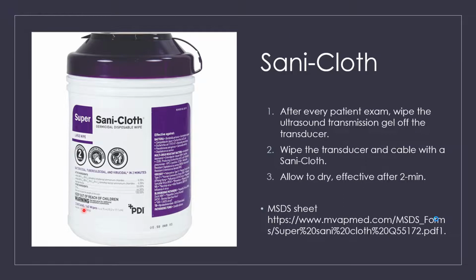Okay, most facilities are going to have these purple top Sani-Cloth wipes. Use these after each patient. Wipe the ultrasound gel off the transducer, and then you're going to get these Sani-Cloths and disinfect it. Do not just disinfect the top, but use the cloth to also disinfect the cable of the transducer as well. You'll allow this to dry, and it is effective after 2 minutes. Okay, and then there's the MSDS sheet if anyone needs to access that.